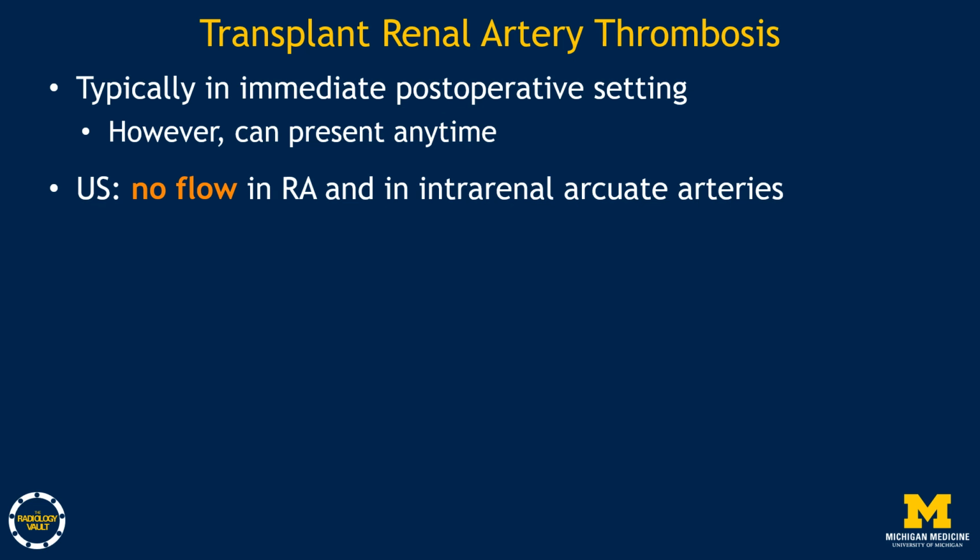Transplant renal artery thrombosis is typically seen in the immediate postoperative setting. However, it can present at any time. On ultrasound, there will be no discernible flow in the renal artery and in intrarenal arcuate arteries.